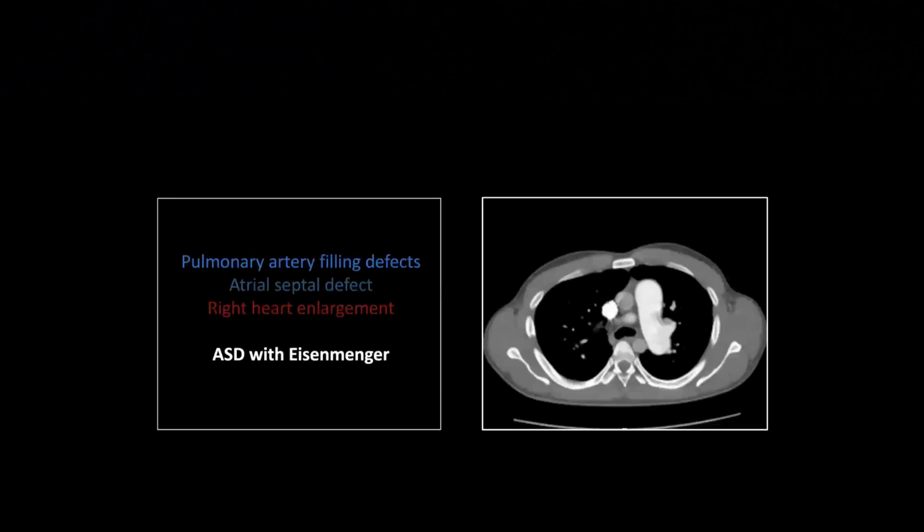It's because they basically thought it could be of adrenal origin. All right, next, an ASD with Eisenmenger syndrome. And it is Eisenmenger. I have to look it up with some regularity, but everybody always says Eisenmenger. So there's a little filling defect here.